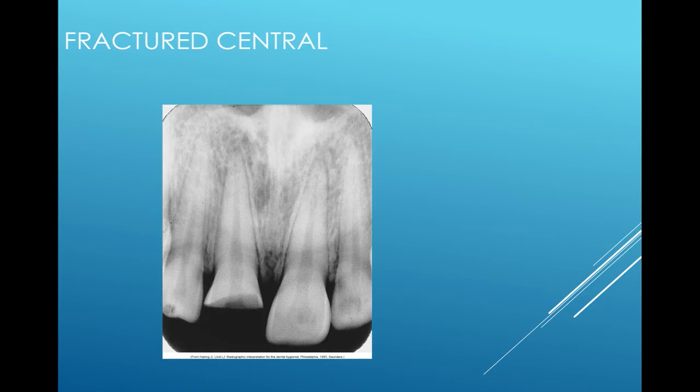So we have here the fractured crown of a central incisor. This one's pretty obvious. So here's a fractured crown. It does most often affect the anterior teeth.